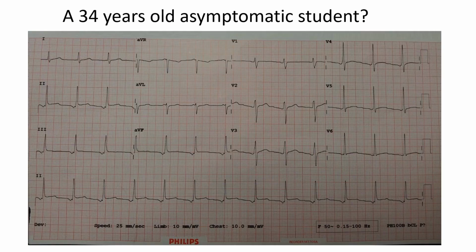Hello colleagues, today we will be discussing a case of a rhythm disturbance. This is a 34-year-old gentleman who presented to the cardiology department because there was some issue on the ECG as reported by his clinician. So this was the ECG taken when he presented.